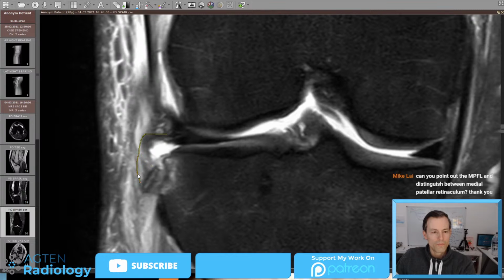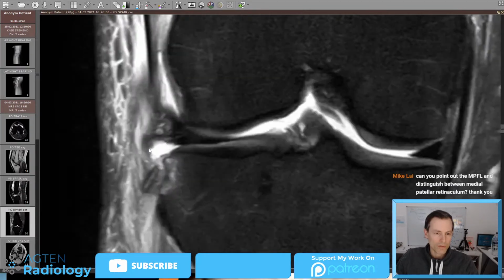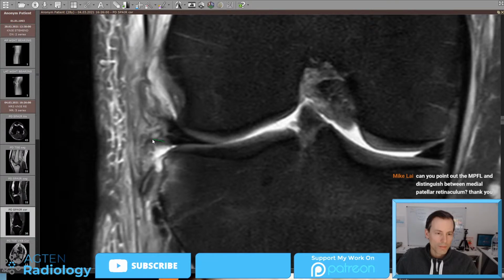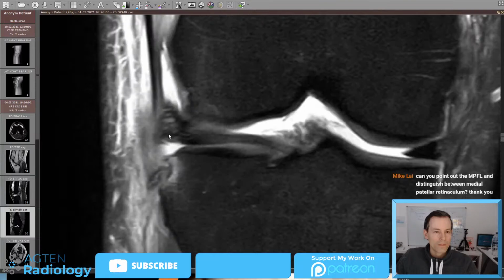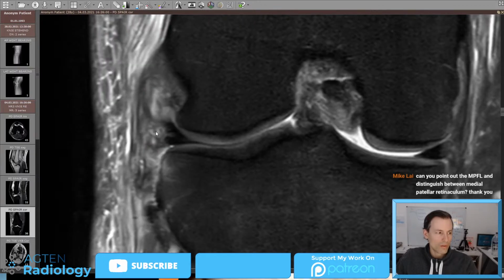So this means now either this component is also injured, which is most likely the case because we can't see any obvious ligament-like structure here. We see a little bit here, but then this kind of black line vanishes and it's all dirty, and so it will be a partial tear at least of the tibial component. And even here we don't see this smooth ligament that's going up here like the meniscal component of the ALL, and certainly we cannot see anything covering here the lateral inferior genicular arteries or artery and vessels here.